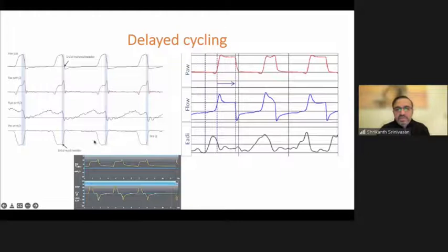In a pressure time scalar, if you see a positive spike towards the end of the inspiratory phase, the spike is occurring because here the patient is trying to exhale while the inspiration is going on, right? So there is movement of air from both sides. Since there is movement from both the sides, there is an increase or a spike in the pressure towards the end of the cycle.